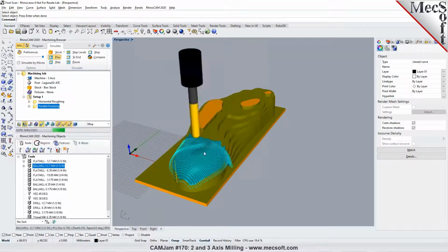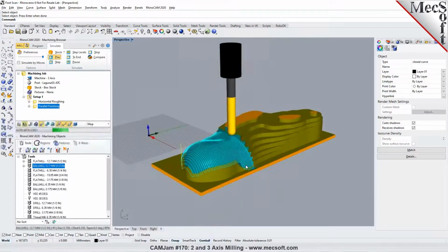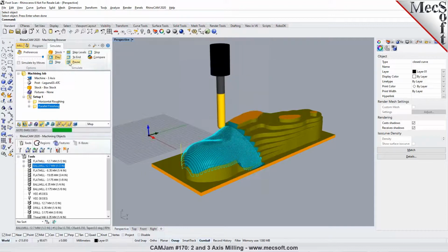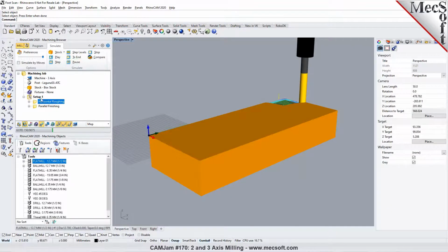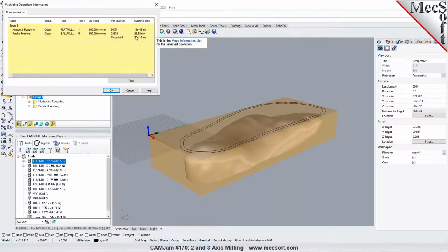Okay. Yeah, because this way would it take a little bit longer to mill if you're doing it along X versus doing it along Y? It shouldn't take a lot. The time, you can look at the estimated time. If we go to information, let me pause this here for a moment. Let's right click and do information. So we're cutting along X. It's estimating, if I'm cutting at 600 millimeters per minute, which is, I would say, significantly slower in terms of feed rate, it's going to take about 28 minutes.